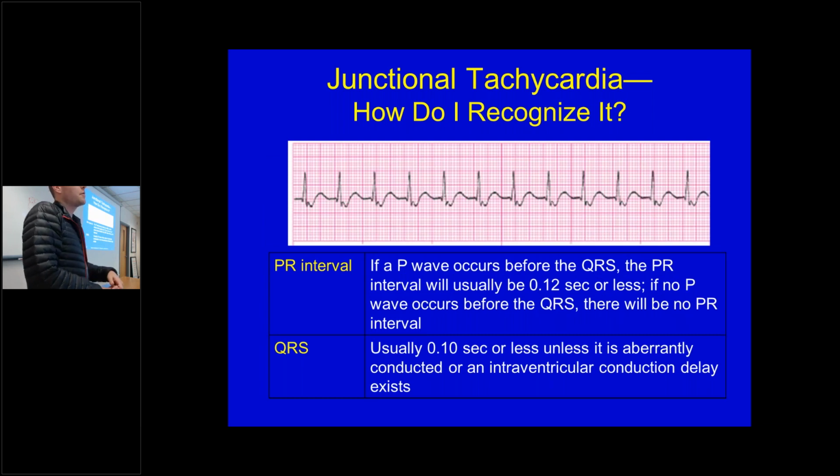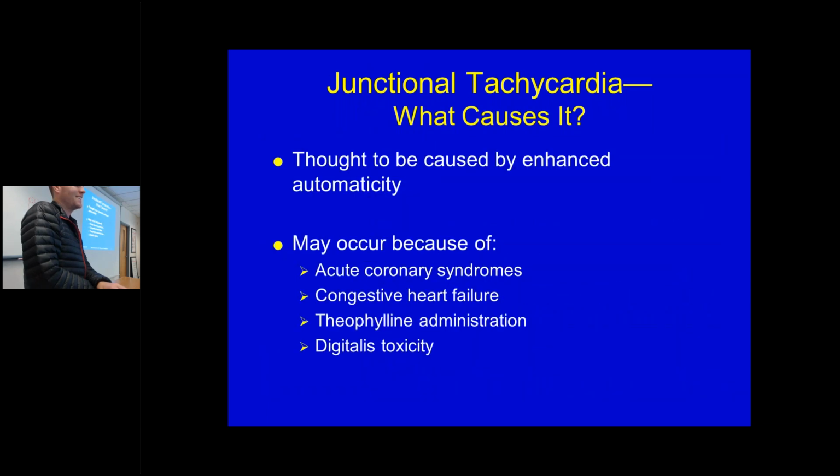Well, let me phrase that differently. The inverted P wave is in the ST segment on this rhythm strip. I think you're right. I would concur. But thank you for asking my opinion.